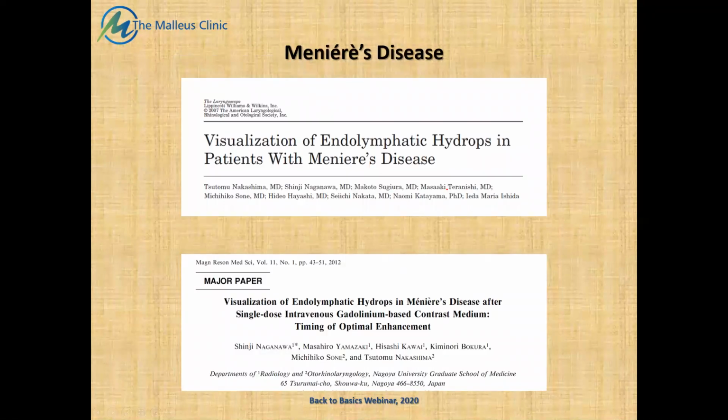Okay. A lot of publications have come in, especially from the Nagoya University. And this is the gentleman who's been at it for the last 20 years, Professor Shinji Naganawa, who's been advocating, who's been actually working on the visualization of endolymphatic hydrops in patients with Meniere's disease, and even otherwise.